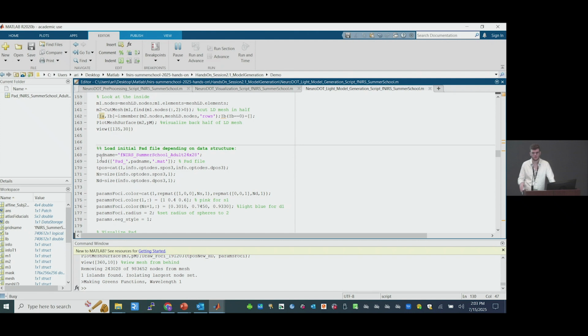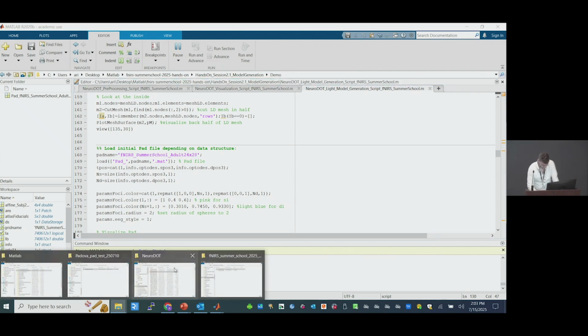But if you're doing adult, the MNI 1 millimeter segmented volume should be pretty solid. We also have segmented volumes for younger children. I believe we have 6 months, 3 months, 1 month, and I think we might also have 6 years. Okay, and you said the 1 millimeter, the common one, is in the toolbox. I can show you where that is in my file directory. Thank you.